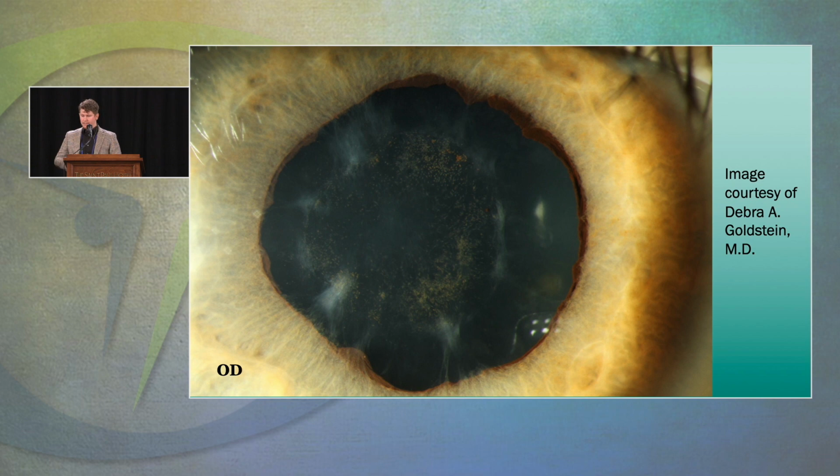This right eye in this patient has posterior synechiae, nearly 360. In kids, they can be very subtle. It's not that bright white. It's these fibrous bands that are developing that are very, very small. You can see them nearly 360 in this case.